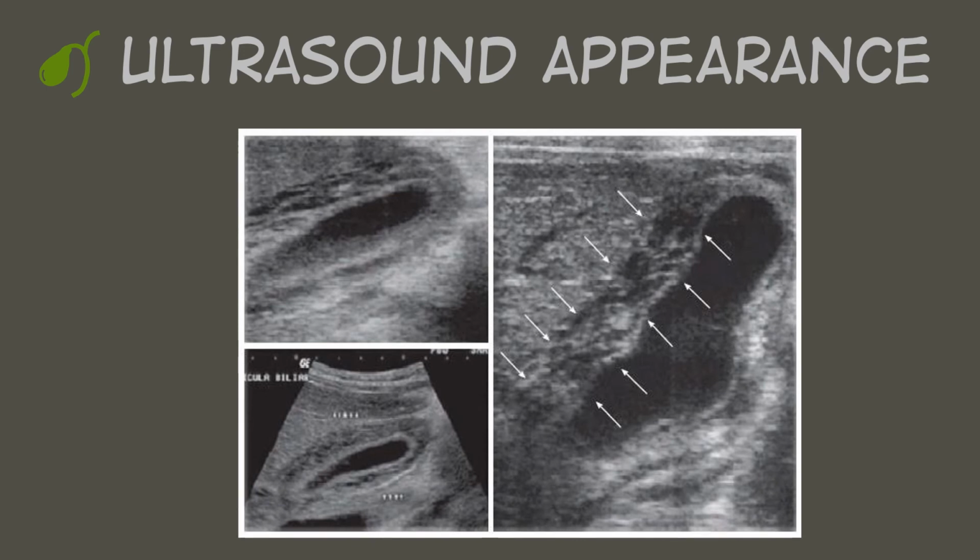These pictures here show more examples of acute cholecystitis and really show the gallbladder wall to be very thickened. And what you'll see through this gallbladder wall is that it has striations. And striations are kind of a last level of acute cholecystitis. This gallbladder has to come out pretty much immediately. So it does kind of start out as a thicker, echogenic, 3 millimeter plus wall. They can get up to 7 millimeters, 9 millimeters, and then start to have kind of these cystic spaces in between them. Those are going to be more concerning for more advanced, more difficult cases of acute cholecystitis.